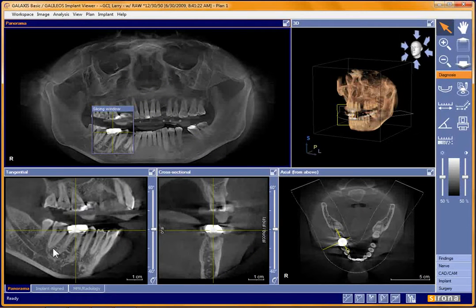Most of the time you're going to be opening in viewer mode, and we can see that at the top title. If it says Implant Viewer, we know that we don't have a license automatically, and we can view and look at many things without the need of a license. We'll look into licenses and how to use that and how to acquire a license in a later class. Today's class is just on the basic usage and showing an overview of the windows.